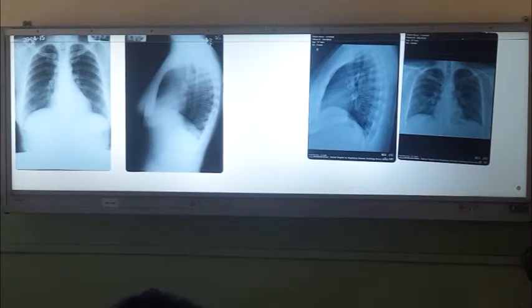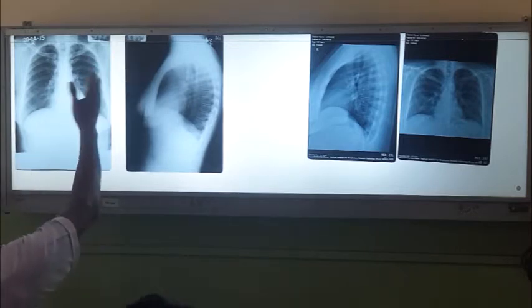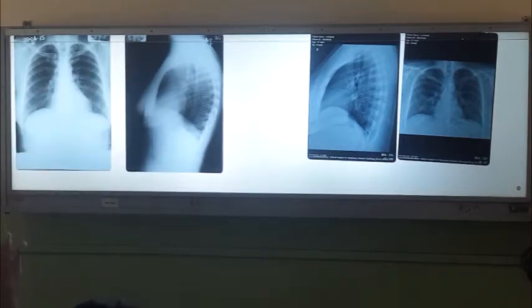Right. So before reading any X-ray, the identification is important, say name, age, everything. Sometimes the date is important, and identification is very important because you might take decisions by looking at all the X-rays, right? And then even if the X-ray is normal, you get the patient to preserve these X-rays, keep them. Later on they are going to help you, right?